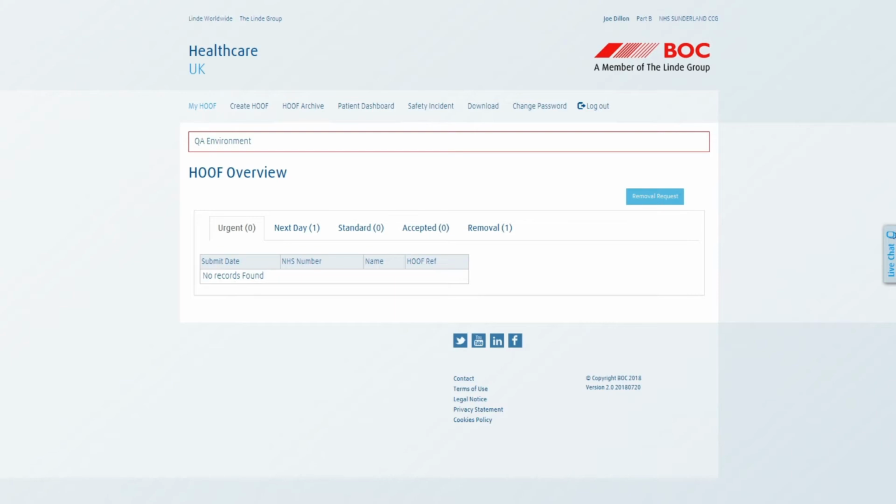I am a data analyst for BOC Home Care, and in this short video I will be demonstrating how you can use the BOC Home Oxygen Portal to review patient usage, holdings and other useful data. This will enable you to have more interactive and informed discussions with your patients on their home oxygen prescription and usage.